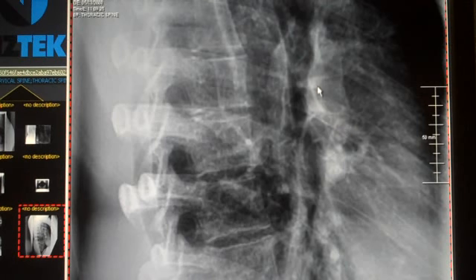We out here can see the hilum, also known as the hilus. We can see the area of the heart over in this area. And so these are the structures that you're looking at in the chest cavity.